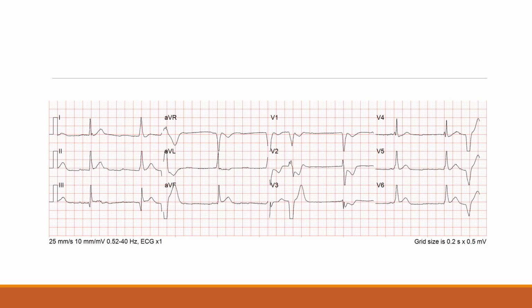And this is a beautiful example of this, because this patient is having chest pain, and there is no clinically significant ST elevation anywhere on here. So if you're classically trained, you just go, oh, well, it's not a STEMI. But when I look closely at this, there are some problems. I see ST depression very predominantly in V2.